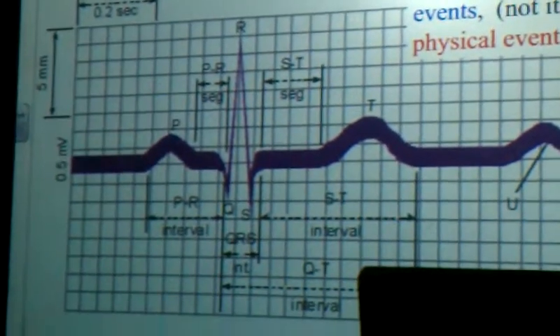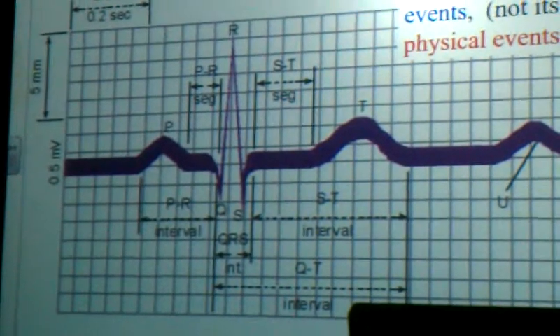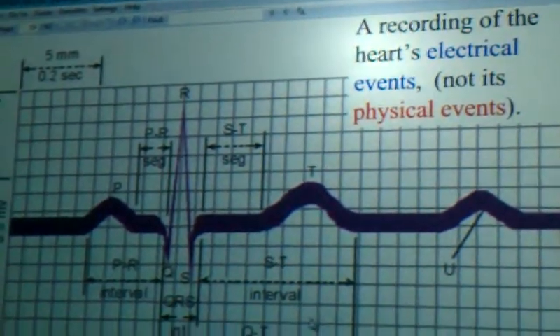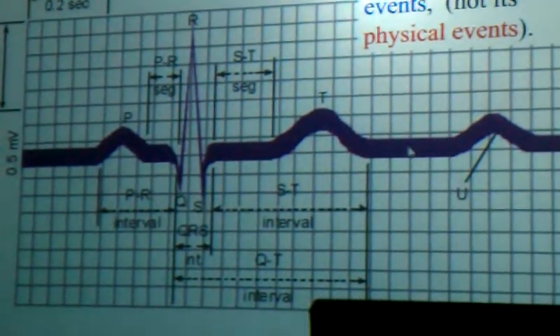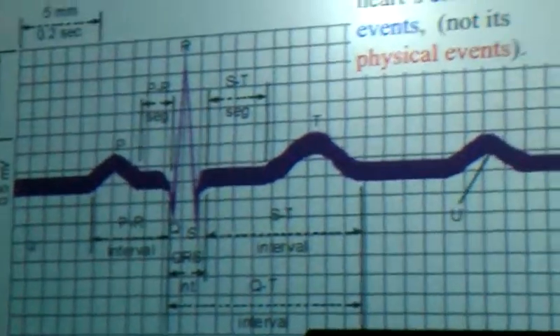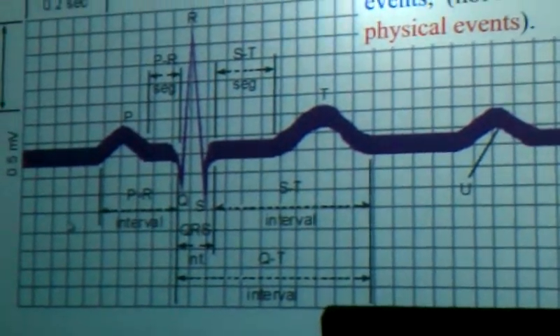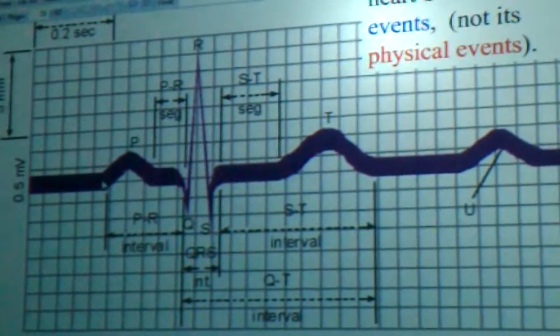There are different things you can do. Usually the machines that are made nowadays will do it all for you. It will even diagnose problems based upon the actual rhythm strip, the waves and complexes. Okay. Now, what are we looking at here?